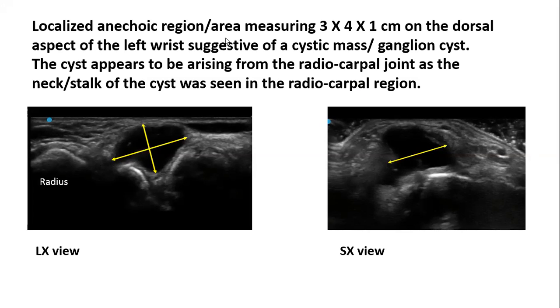Okay. It's good to know some general principles and what generally a tissue looks like. We know bone is hyperechoic, muscle is hypoechoic with hyperechoic fascicles, and tendon is mostly hyperechoic. But once you know the general sonographic appearance, try not to be so rigid in your thinking that you should always see tendon as hyperechoic and bright, or muscle as hypoechoic, because it depends on what structure is on top of it and what type of pathology you're seeing.